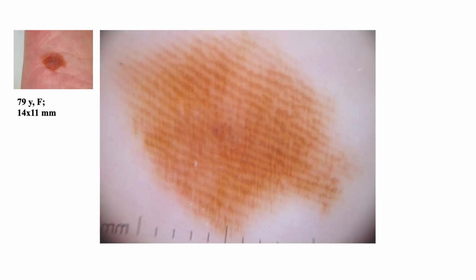This is a very important case. A light brown patch, 14 mm in diameter, seen on the sole of a 79-year-old woman. Dermoscopic findings of this lesion seemed to be an irregular fibrillar pattern. The furrow ink test revealed that the surface grooves are spared from the fibrillar pigmentation. Is this fibrillar pattern regular or irregular?